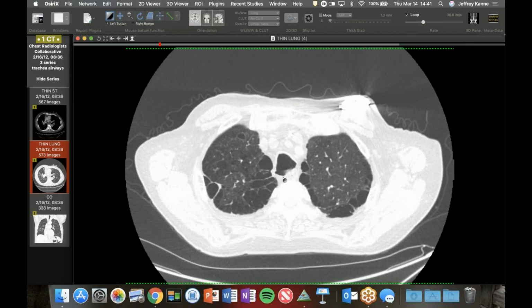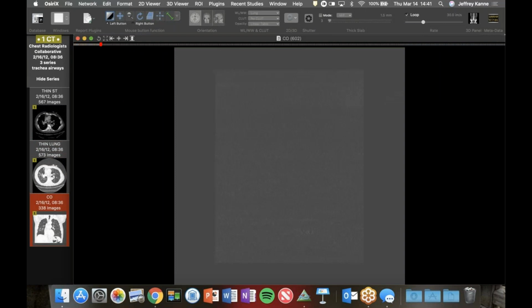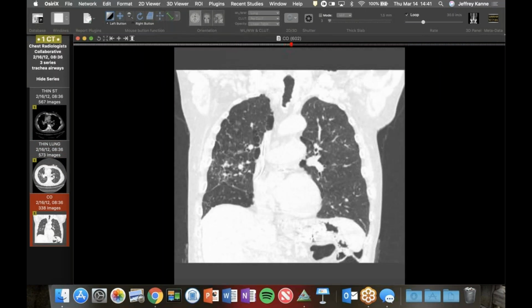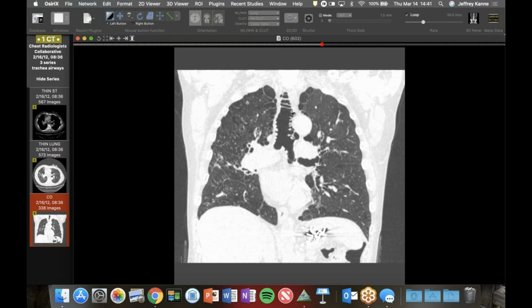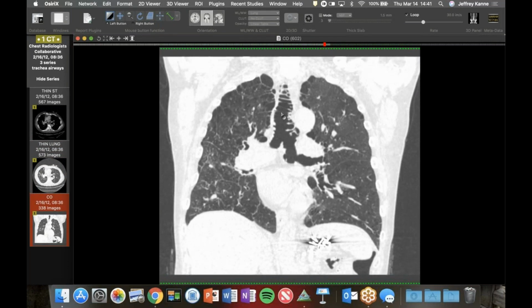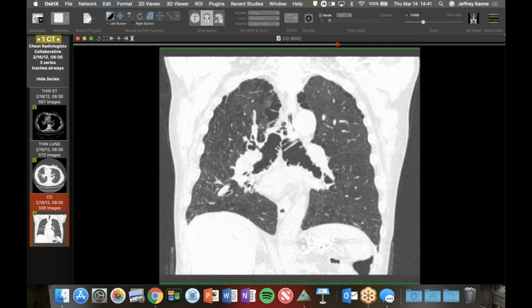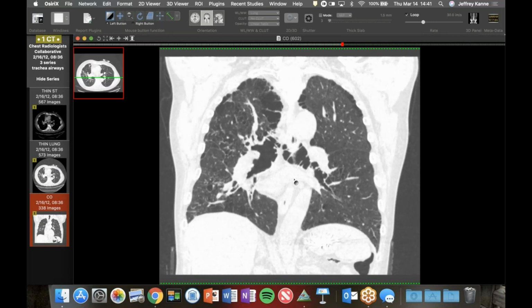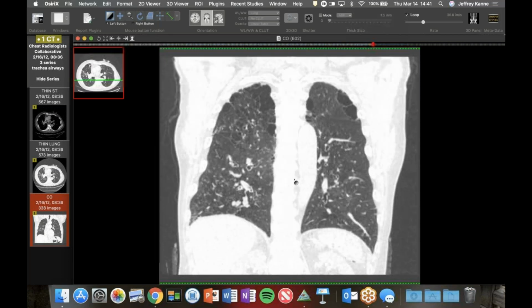The trachea is a little large, but it's not massive. But if I show you on the coronal, the morphology of the trachea has this corrugated appearance with these outpouchings, these sort of diverticula, or at least deep recesses, and these really striking little folds in it. And then you'll notice the main bronchi are quite dilated and have that similar morphology, and they're almost as big as the trachea. And then we taper a little bit and get more conventional bronchiectasis.